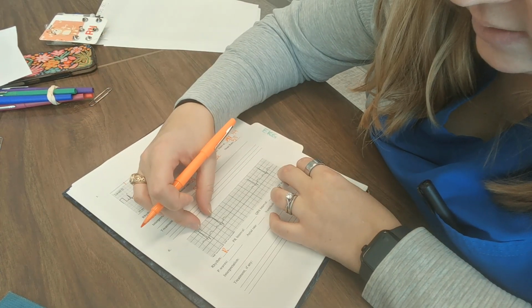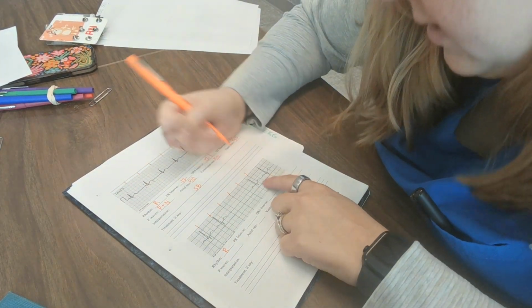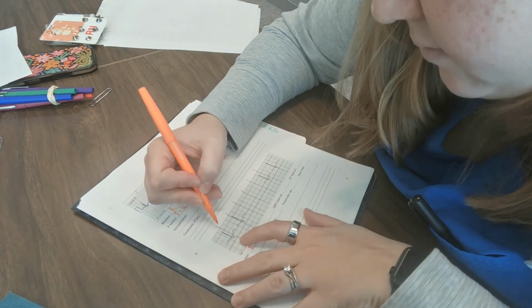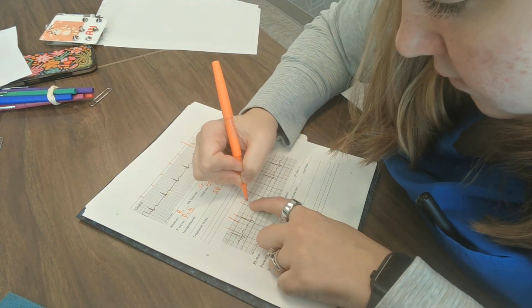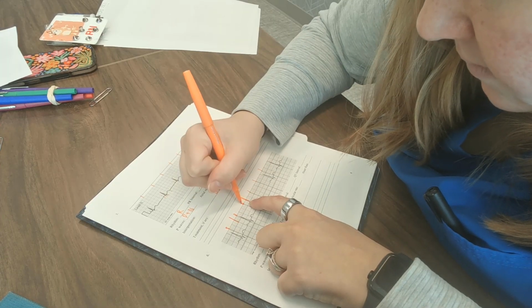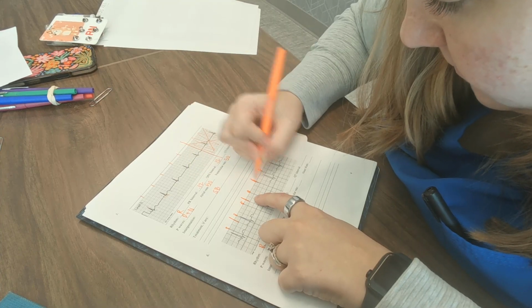So when you're looking at it, you can kind of tell I have, first of all, 1, 3, 4. So I actually have a little bit too big of a strip here as well. Wait, no. 1, 2, 3, 4, 5. Here's the second. Ignore these small lines, y'all. 3, 4, 5.